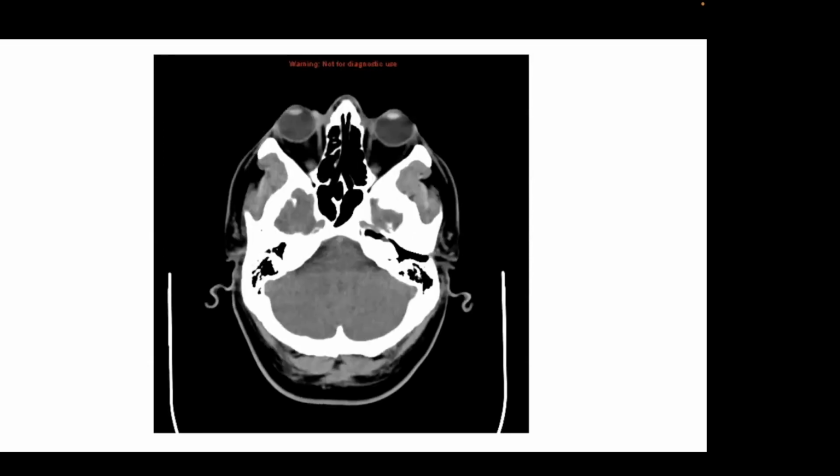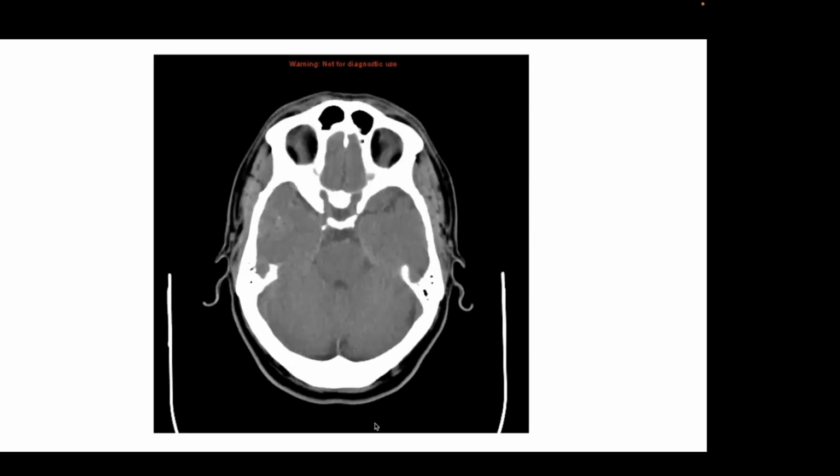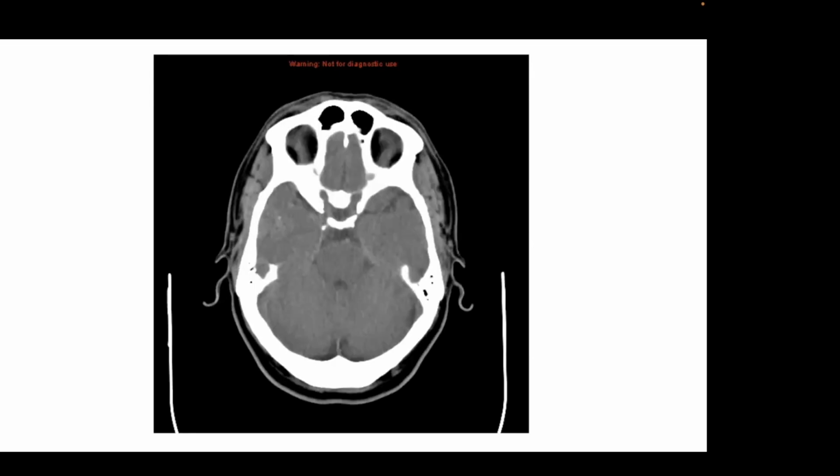So as we look at this CT scan, this patient I remember quite well. I thought I had the history on here, but this patient was found. This was the last case I saw on a weekend when I was on call, and I spent some time looking at it, having looked at I don't know how many cases that day, 100 cases. But there was something about the case that got my attention.